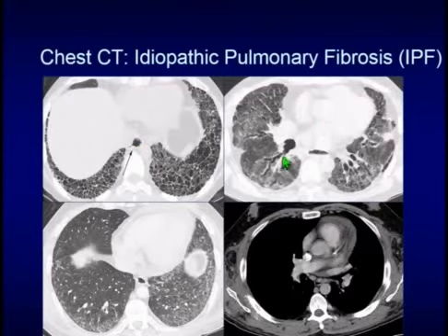On your right, on the top, we see another patient with UIP, but notice, again, you see the dilated esophagus, but not quite the honeycombing, and you see a lot more ground glass in this case. And so again, not your classic UIP pattern, and the degree of ground glass may make you think it's something altogether different than UIP, but again, this turned out to be scleroderma lung disease with UIP.